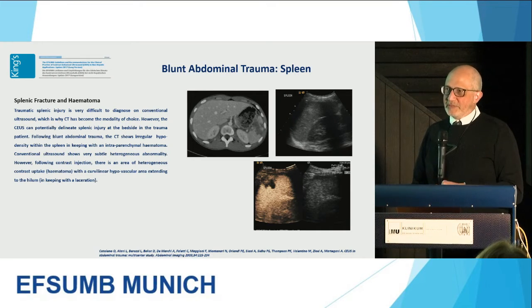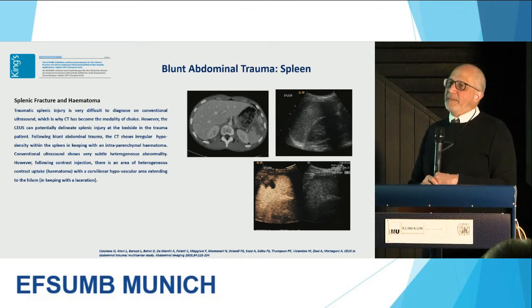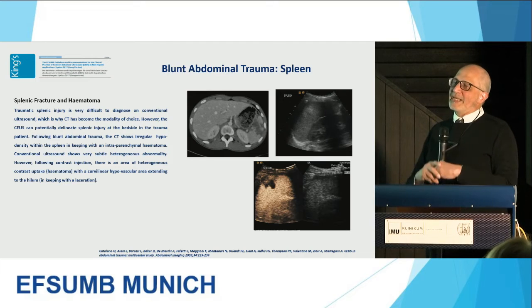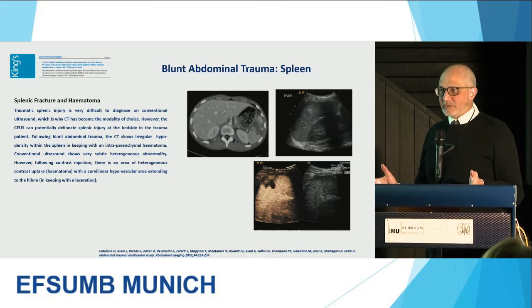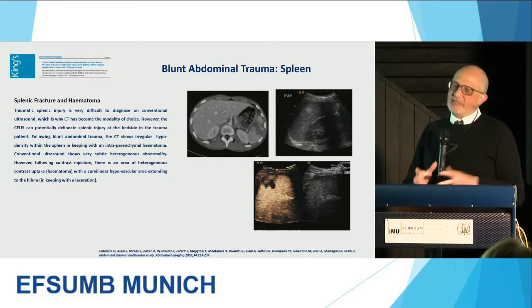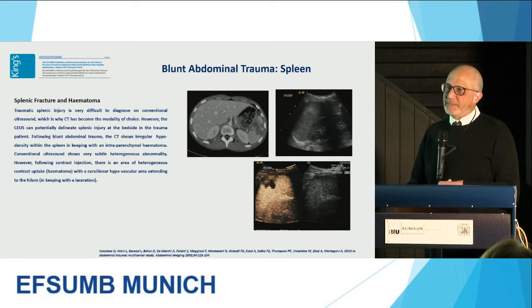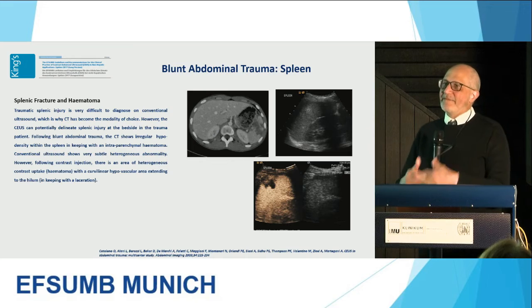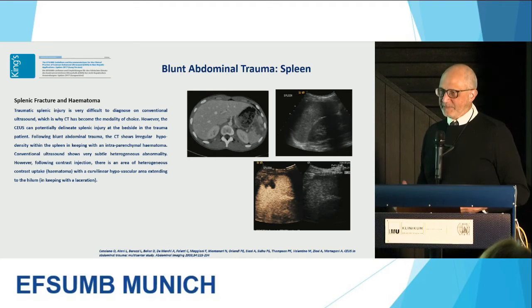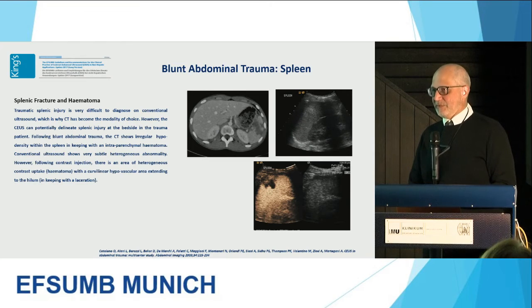There are 2 groups of thought in the pediatric patient. There's a group of people in Rome, pediatric doctors, who've actually used it as a triage tool in children. So if the contrast-enhanced ultrasound is normal, they get sent home. There is another group with pediatric trauma, and that's our group, who say, well, if they're being brought in by a helicopter and landing there, get the baseline CT. But the baseline CT will identify for you where the issue is. And thereafter, you follow it up with a targeted contrast-enhanced ultrasound.